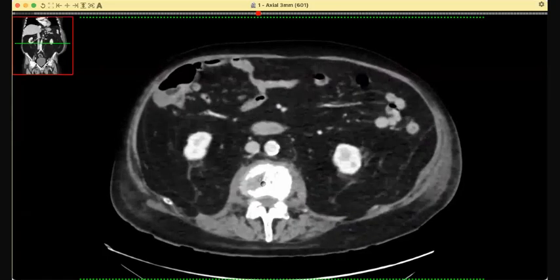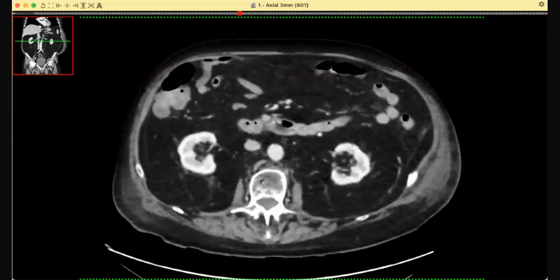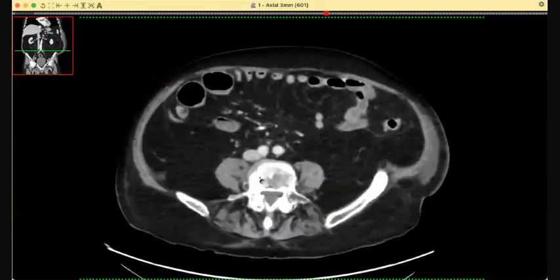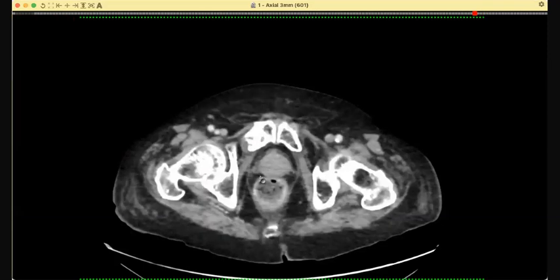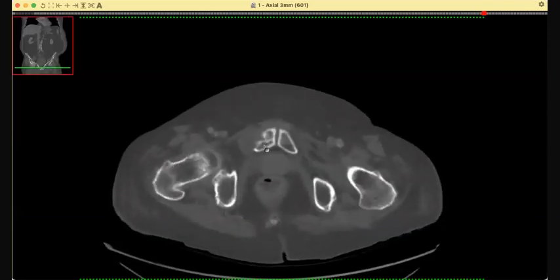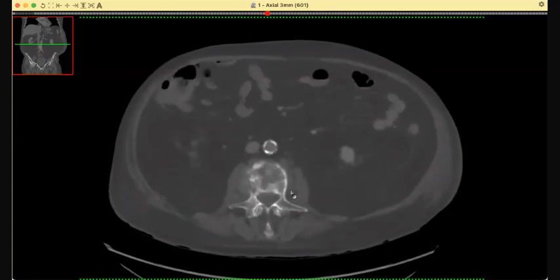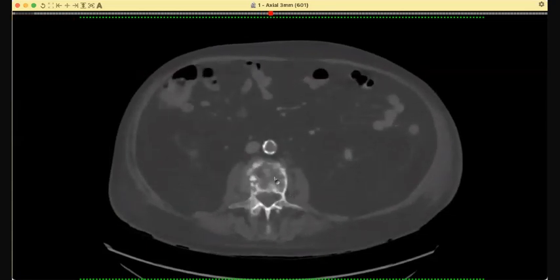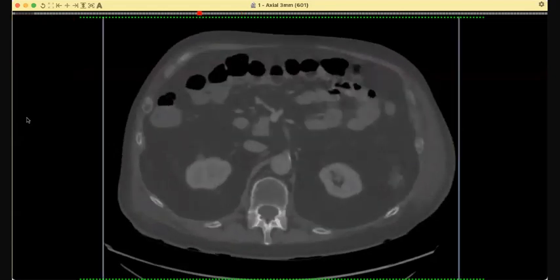Actually, there was a fracture, which is a pathological fracture, secondary to the metastasis and secondary infection. So now, just to make a point, this was also an old fracture with metastasis. And then here you are. This is that area where you can see fractures. I've shown you the soft tissue abscess.